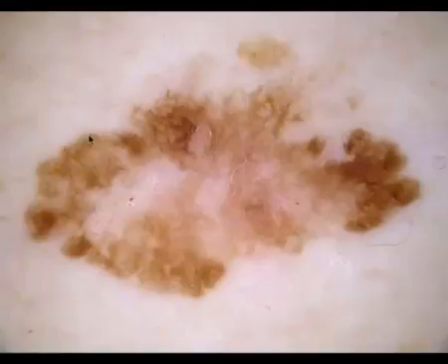But we can make the diagnosis of seborrheic keratosis because of the sharply demarcated scalloped border. There's another interesting finding. We can obviously see a pigment network here. So reticular lines or pigment network does not necessarily mean that this is a melanocytic lesion. Whenever you want to become an expert in dermatoscopy, you have to avoid cliches.